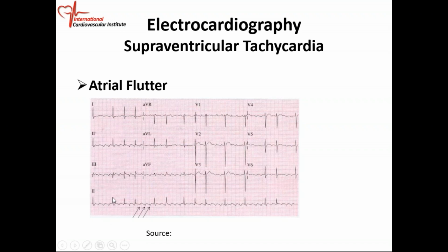You can see that the ventricular, remember the QRS represents the ventricular response. The ventricular rate is irregular because the AV node is protecting the individual, because the AV node is not going to transmit one-to-one. The AV node is going to slow the atrial flutter or the atrial tachycardia. Okay, it's going to allow it probably 4-to-1, 3-to-1, 2-to-1. This is what we call atrial flutter with variable AV block. So there's not a fixed pattern. It's not 4-to-1, because in this one it is 1, 2, 3. In this one it's 1, 2. This is 1, 2. This is 1, 2, 3. So it's variable.